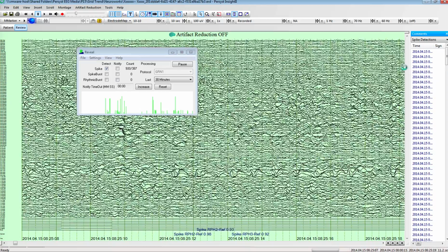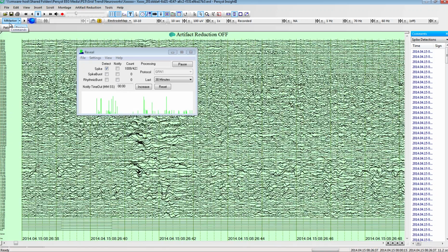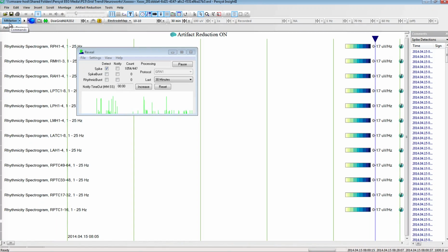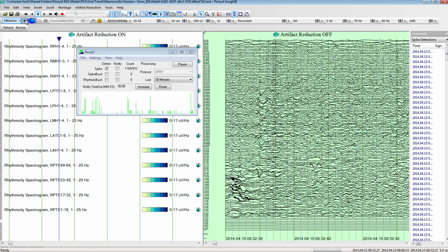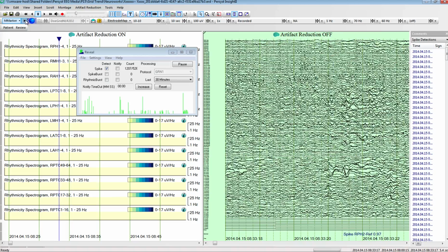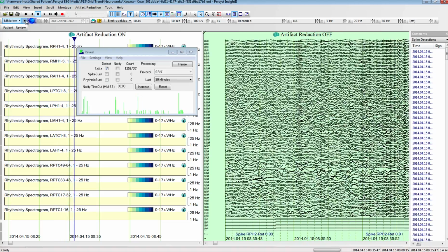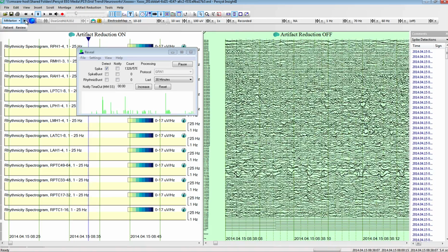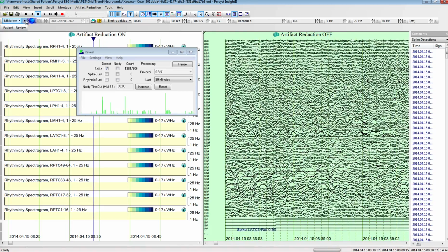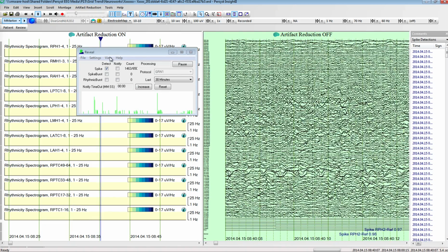Now I had set up trends for this as well, and you can run those concurrently. So let's select the M marker button here at the top. We can split the screen. There's a little splitter at the bottom, and we could even begin trending this at the same time. There's a guide on how to set up trends for this, so we can watch the building of trends as that proceeds. The spike detector is ahead of the trend display there.